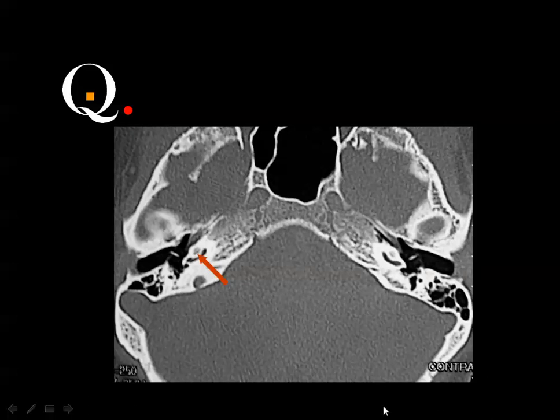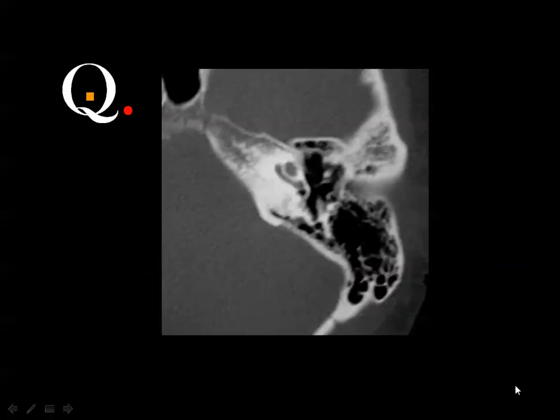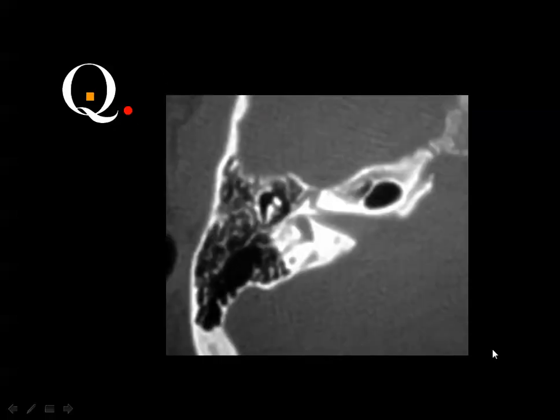In this example, you can see the dish with food inside, representing 1.5 turns of the cochlea, and this is the cochlear aqueduct, which is similar to the internal canal but smaller and inferior. Then you remember that there are two depressions and one elevation. The medial depression is the sinus tympani. And here you can appreciate the 1.5 turns of the cochlea, very good. And this part represents the tegmen tympani, which separates the middle ear cavity from the brain.